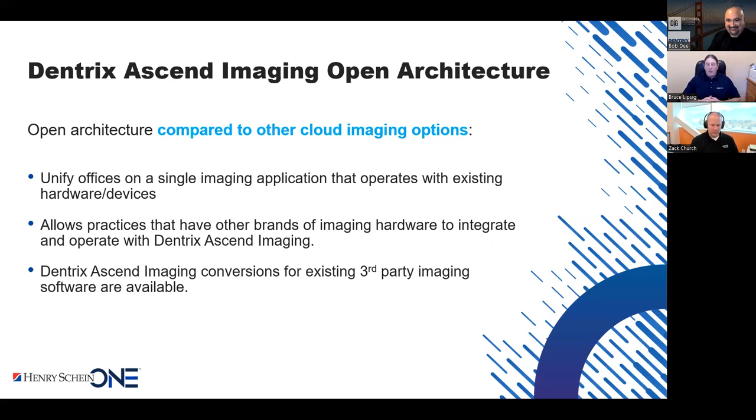You know, there is so much more to Ascend. A cloud-based product pushing out updates automatically. Once you log in, everything is there. New devices are supported. Things are happening while you're not even knowing that they're happening. That's why I started our conversation, Dr. Bob, with I really feel we have something special here. I really do. Because the cloud gives us such convenience, because the imaging was designed, created, and embedded in the practice management for the practice management, because the practice management takes advantage of the embedding and automates the workflow, which we're about to go through shortly.